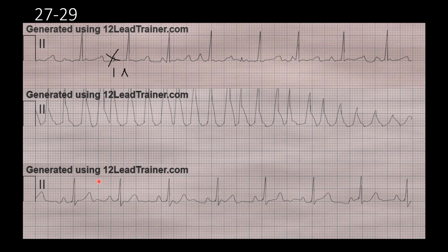There's no PRI. Our QRS looks wide. And it starts really tall here, and then if you notice it gets smaller here, and then we can't see it here, but I bet somewhere around here we have a twisting where these then become more negative. So this right here would be torsades.